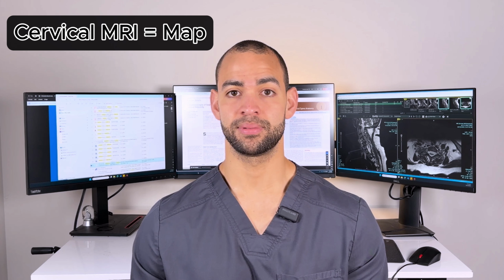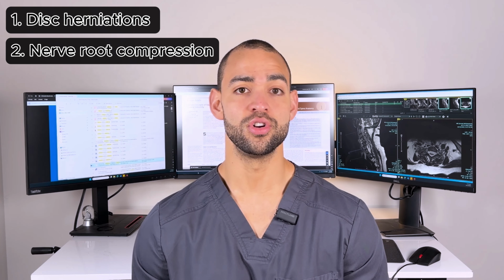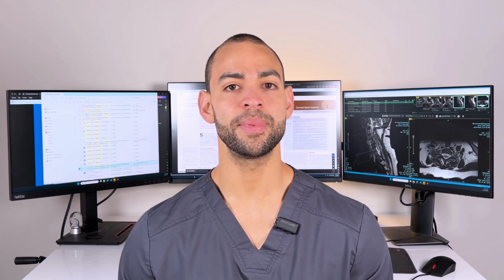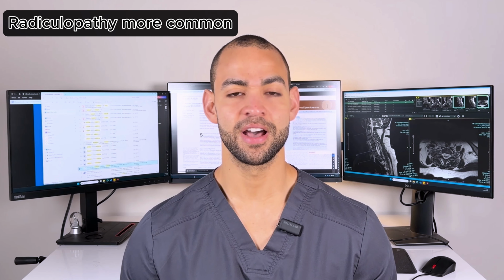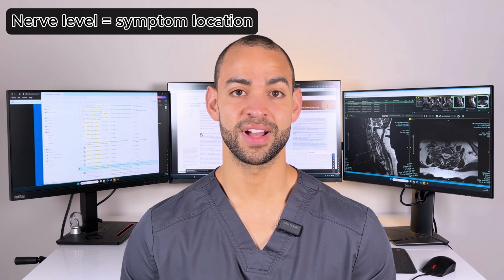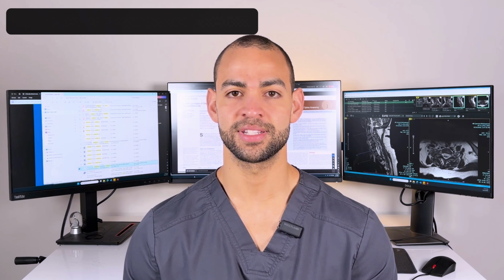Here's the summary. A cervical MRI is a map. The three big things we evaluate are disc herniations and their location, nerve root compression causing radiculopathy, and spinal cord compression causing myelopathy. Of those three, myelopathy is the one that demands the most urgent attention. Radiculopathy, arm pain and numbness from a pinched nerve, is the most common presentation. And the level of the nerve, as I showed you, tells us usually exactly where on your spine the problem is. But the MRI is just one piece of the puzzle.